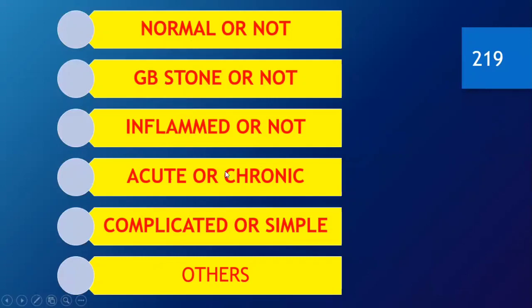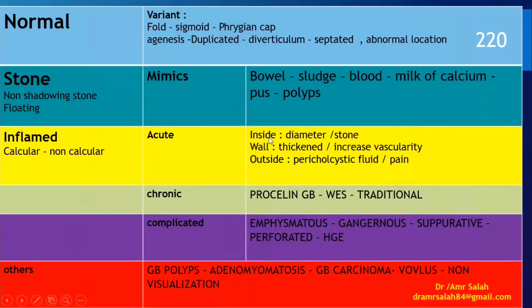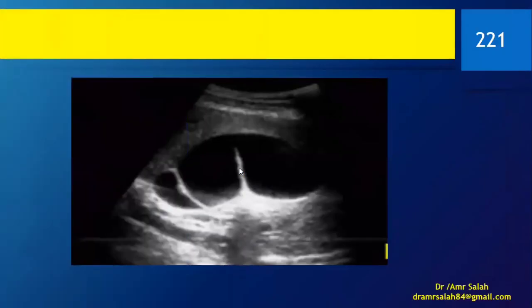All right. So let's wrap up the lecture with this little quiz, okay, to verify that we have undertaken everything. Okay, now I want you to think about everyone. Give yourself a sec, okay, and think about what is this? Is this a fold or a septum? Helping you out. Voila, this is incomplete, so this is a fold.